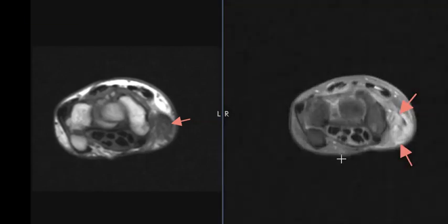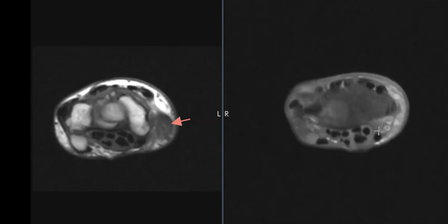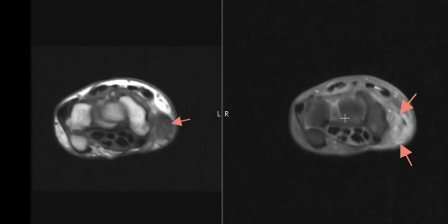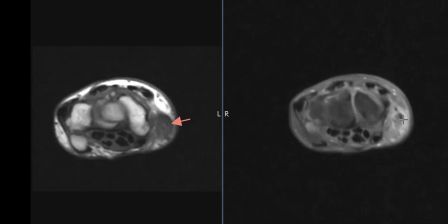This can be associated with pregnancy and overuse type injuries. It's usually in females between 30 and 50 years old. And it can be associated with inflammatory conditions such as rheumatoid arthritis. And I believe this patient, because of her erosions, may have rheumatoid arthritis, and this may be associated with that. But again, here you can see this severe inflammatory change along the abductor pollicis longus, along the radial aspect. And again, a case of Quervain Tenosynovitis.